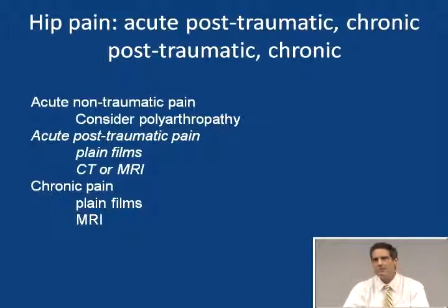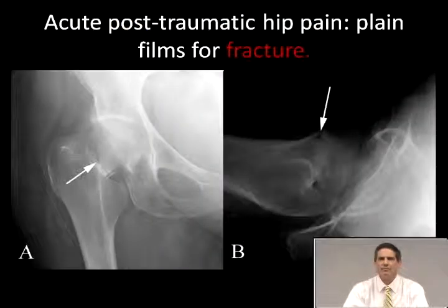Well, x-rays are your exam of choice, just like any of these other locations, and you're looking for fracture. Here's a 75-year-old with pain following trauma, a very typical picture of a femoral neck fracture. Straightforward diagnosis, orthopedic surgical case, usually gets fixed. If there's bad arthritis in the hip anyway, they'll just put in a prosthesis, otherwise they'll pin the hip. There are different devices that they use for that, and I'm not going to go into all those here, and that evolves through time, of course.